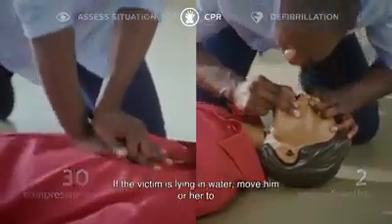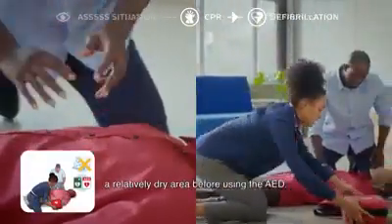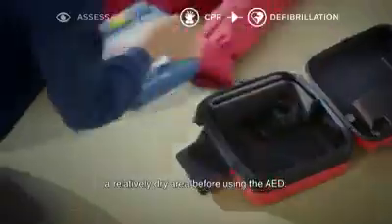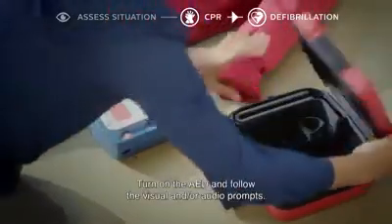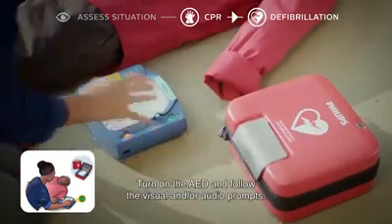arrives. If the victim is lying in water, move him or her to a relatively dry area before using the AED. Open the AED box. Turn on the AED and follow the visual and/or audio prompts.